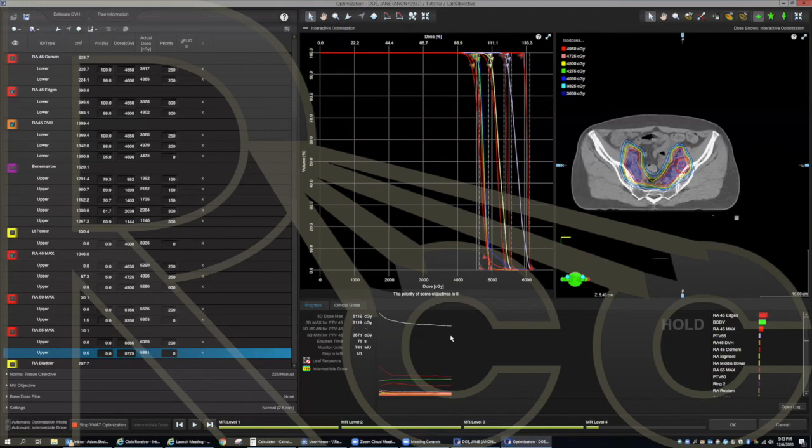And the same exact process, again, I'll use for nasopharynx with 3 SIB and optics involvement and close to cord and brainstem. Very complex cases, but methodical contouring with those 10% per millimeter for smaller organs at risk, 5% per millimeter around structures. I'm able to get really good plans, talking about within an hour 15 or so. Now watch, I'll close this plan. It'll look like a disaster, but.